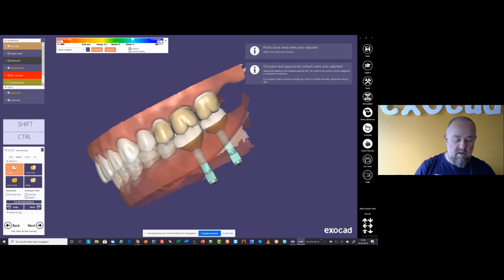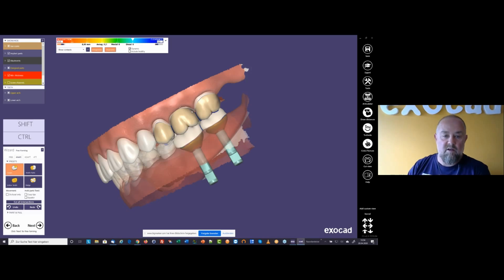So back to the auto articulator, comparing this to the virtual articulator in the lab software, there you have a big choice of different articulators which you can find on the market currently. And there we really copy the dimensions of every articulator and the movements.